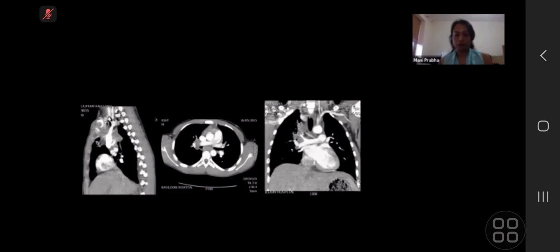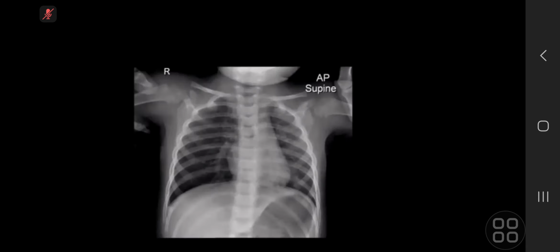Same patient. So this is the mediastinal window in sagittal, axial, and coronal planes with an arterialized study. And I can see low attenuation lymph nodes predominantly in the right surrounding the main pulmonary artery, as well as some enlarged right paratracheal lymph nodes. There's no associated calcification, and they appear to be quite homogeneous, which would be in keeping with TB. There isn't any associated endobronchial lesion.